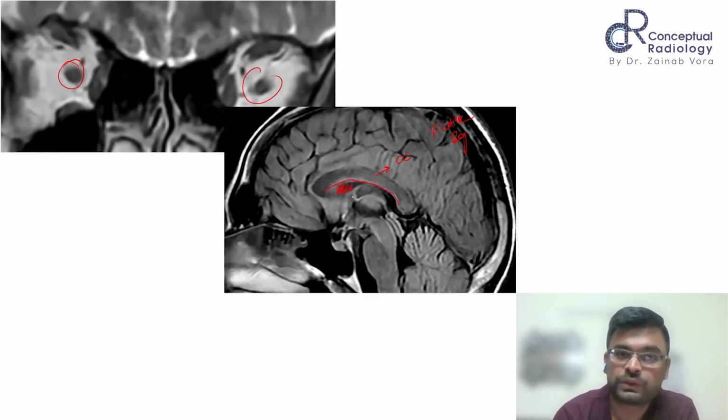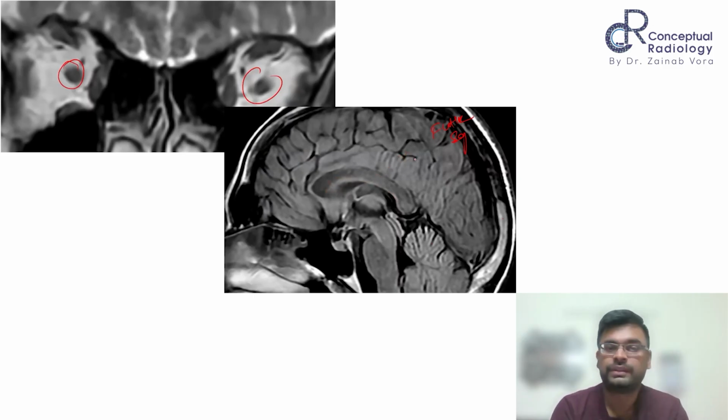So what do you see in pathology? You see lesions in the callososeptal interface in multiple sclerosis. So in MS, you will see lesions here, right? Good, Priyanka. And then in NMO also, what we see is the aquaporin 4 receptors.